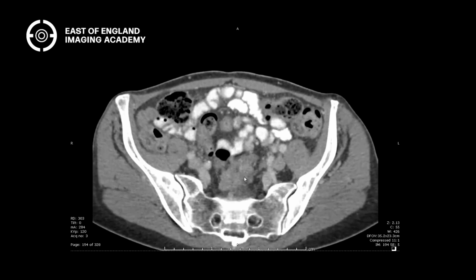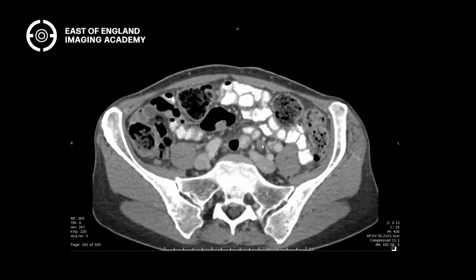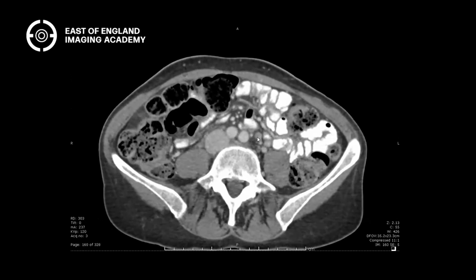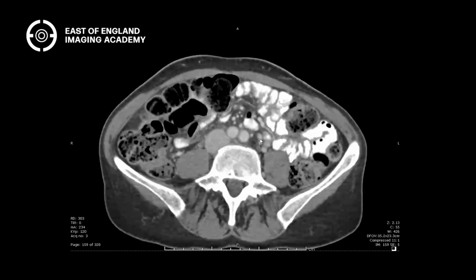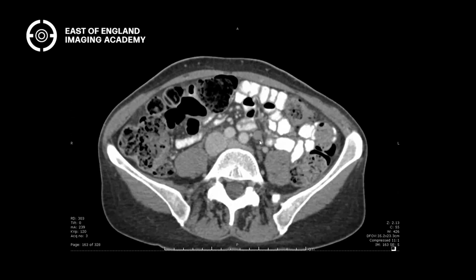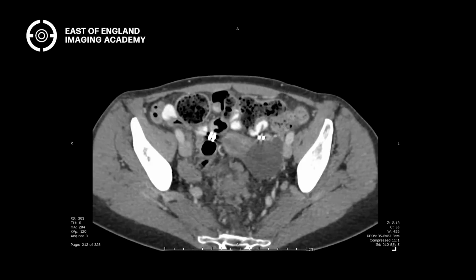You've also got this really unusual tongue of soft tissue that heads up this way alongside the artery. And if you actually follow it, you'll notice it then turns into a vessel. You see that? That turns into a vessel. It goes from a vessel to being this sort of soft tissue filled thing. That is what we call extramural vascular invasion. That's where the tumor actually invades into the vein. And this is a really extreme example of it, where it's actually gone all the way up the vein.